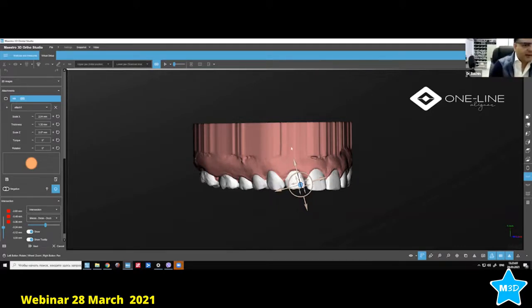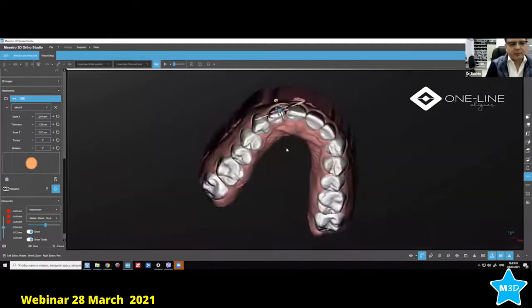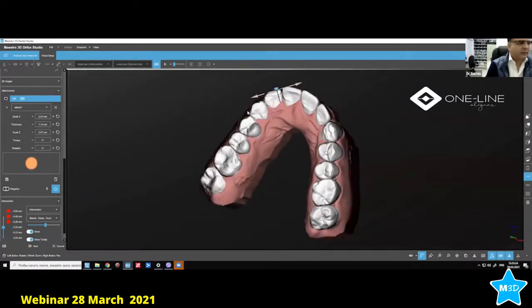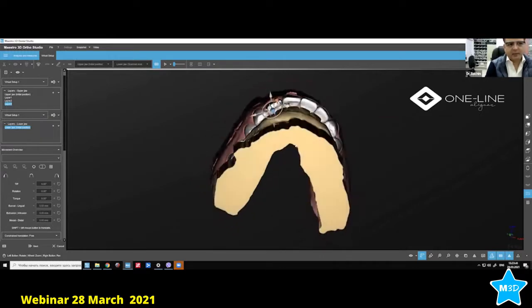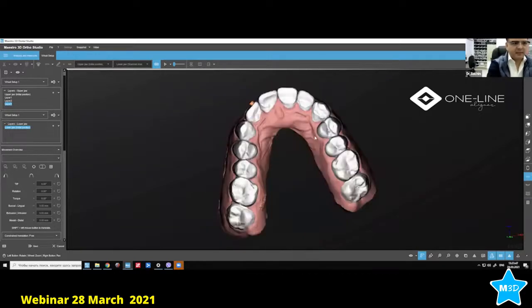Okay, fine. So right now, I don't use this, so we're going to change back. So for 13 degrees, this is good enough. Yeah, so 1.1 is good in this case. We can also double it if we need to. So we have done positive rotation on the lateral incisor, right? And we can also add here. The problem now, if we add on the palatal side, is that you might be having contact with the lower teeth. So I will not be using the palatal side in this case. I'll just delete it.